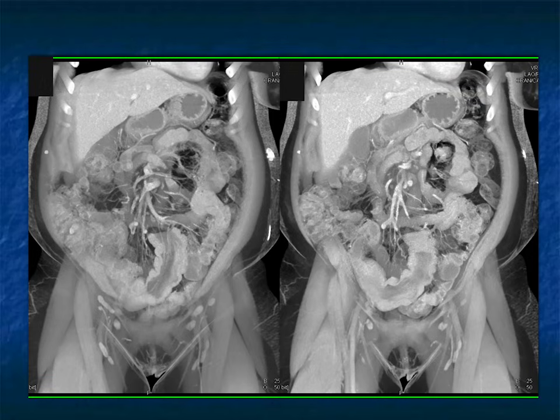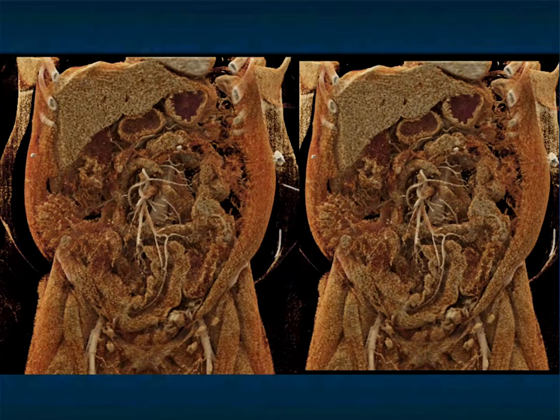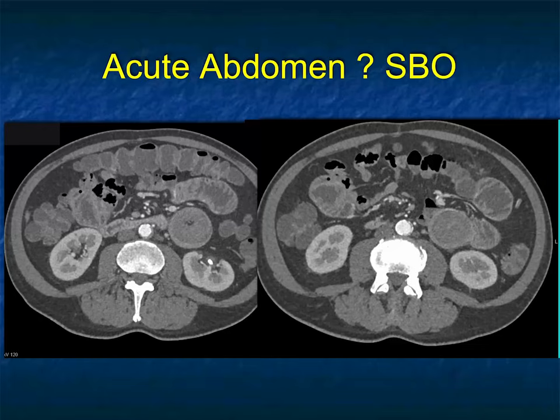And again, here's a few more views of that. You can see some of the vessels being dragged in with the intussusception. Again, nicely showing you that on the cinematic rendering as well. And here it is again. A really nice classic example of an intussusception.